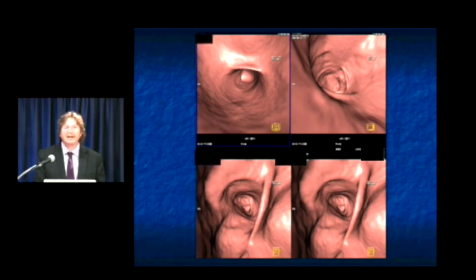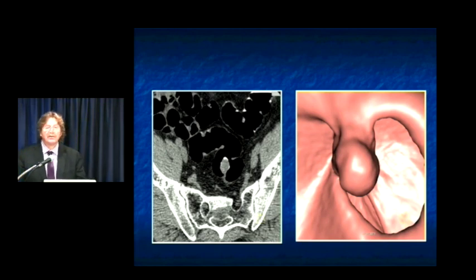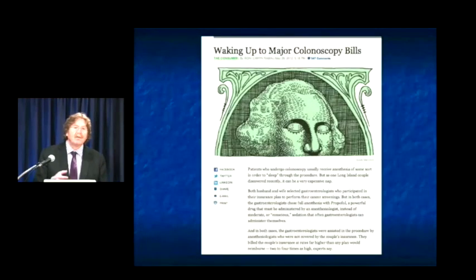We use it at Hopkins occasionally with failed classic colonoscopy or patients who are not very cooperative. But you can see very nicely, we're able to look inside the colon. The prep is the same as colonoscopy. People are working on virtual preps, and if you can do a virtual prep, I promise you, our volumes will increase. One issue, of course, is it's very cost effective.